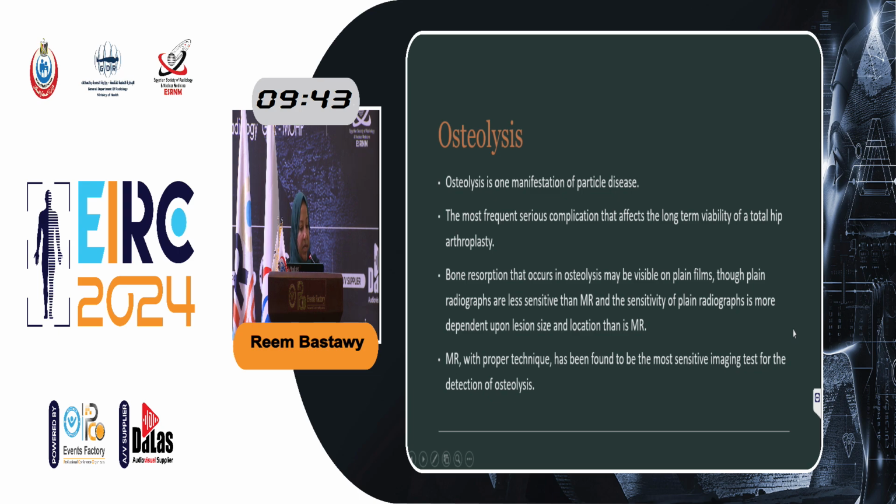Osteolysis is one manifestation of particle disease and the most important and serious complication that affects the long-term viability of total hip arthroplasty. Bone resorption that occurs in osteolysis may be visible on plain X-ray, but plain X-ray is less sensitive than MRI, and the sensitivity of plain X-ray will depend on the location and the size of the lesion. So MRI with proper metal artifact reduction technique has been found to be the most sensitive to detect osteolysis.